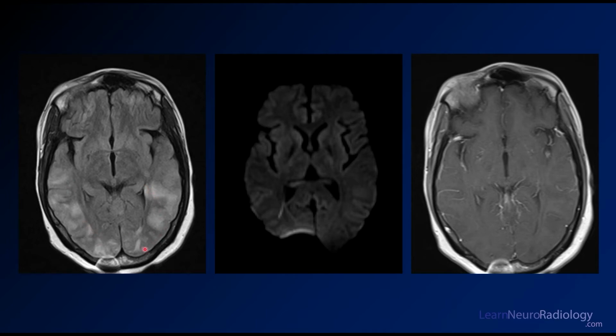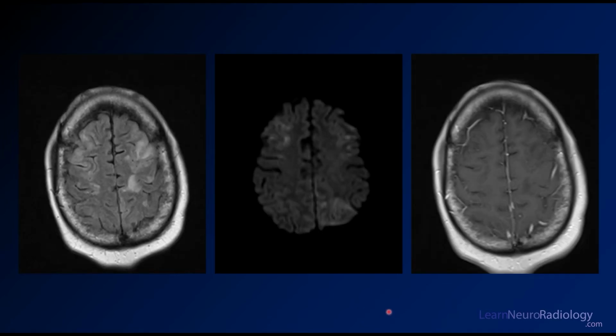So just areas of edema in the occipital lobes, posterior temporal lobe. You wouldn't be confused for thinking this looks kind of like a PRES sort of syndrome because you've got posterior white matter abnormalities. Up here, the diffusion's a little more normal and the enhancement's a little more normal as well, but you definitely have those white matter abnormalities. And you just see more of it as you go higher towards the vertex here. So you're seeing more in the frontal lobe, maybe interspersed with patchy dots of diffusion, not really much enhancement at this level.